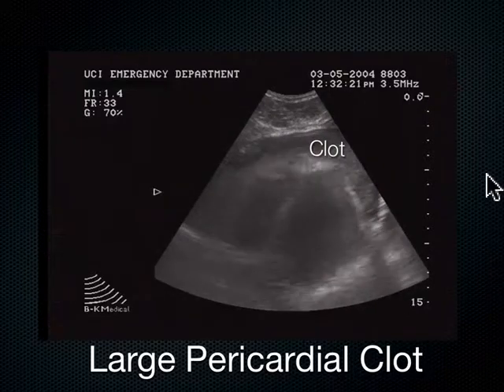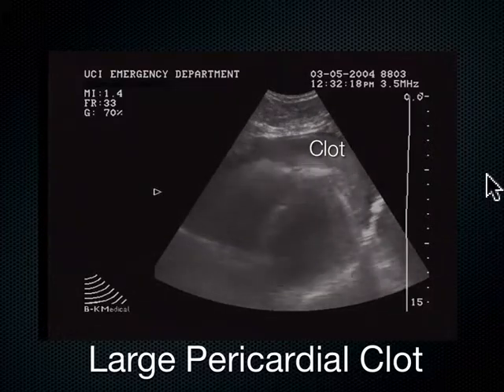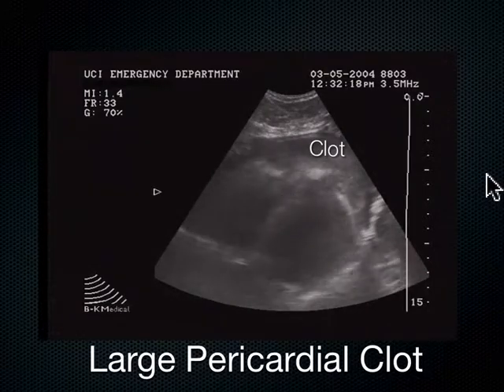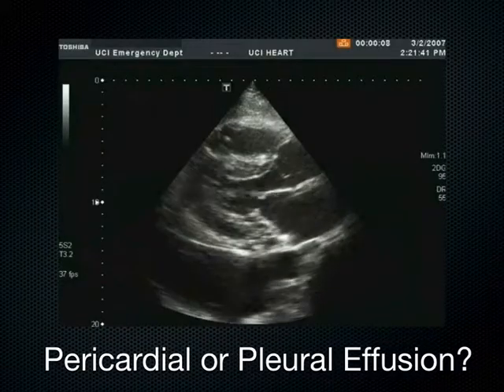Very good point. So I see the trampolining ventricle. I see more than 1 centimeter thickness. I see an isoechoic substance in the pericardium. And I really start to make the case that this is a clot. And I see that the patient had a transmediastinal gunshot wound. No, I'm just kidding. Clinically, I am correlating.